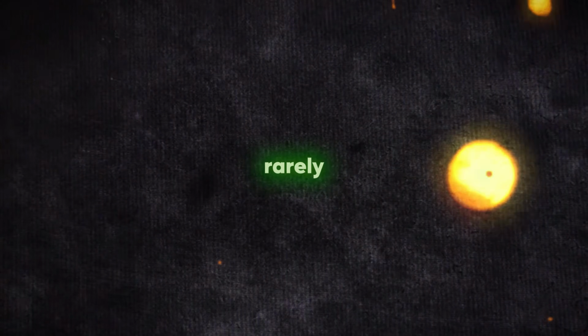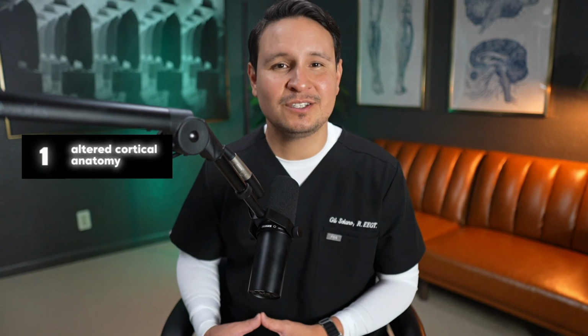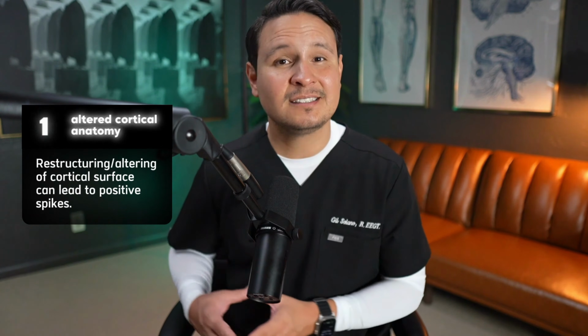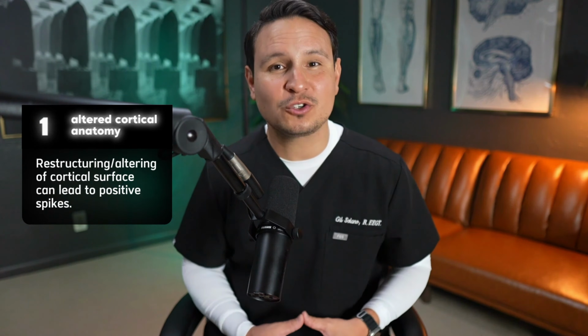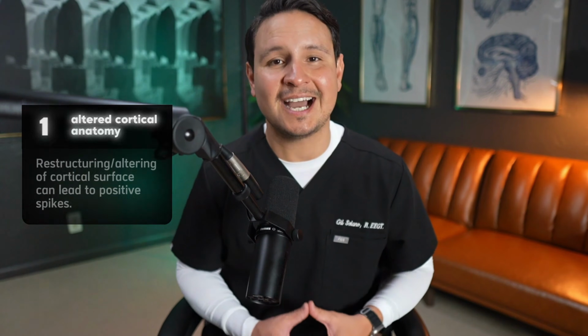Positive spikes are rarely encountered in a typical clinical setting, but they do appear in specific circumstances. One such situation is in patients who have undergone surgery that alters the cortical anatomy, such as those with cortical dysplasia. In these cases, the restructuring of the cortical surface can lead to positive polarity in the IEDs.